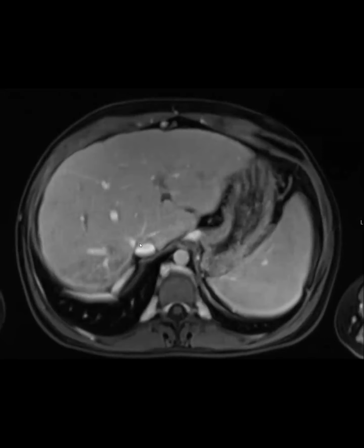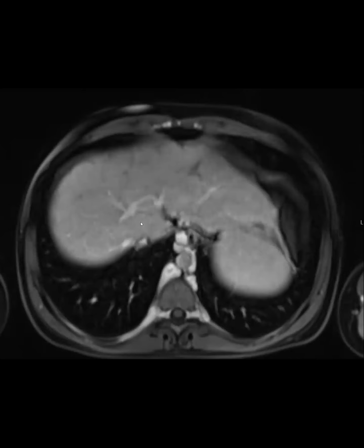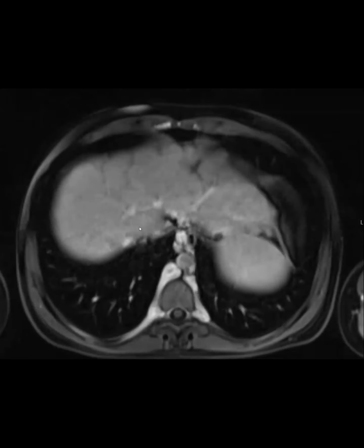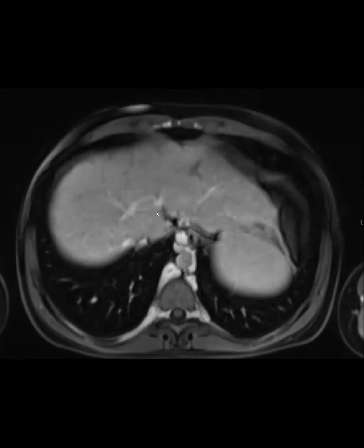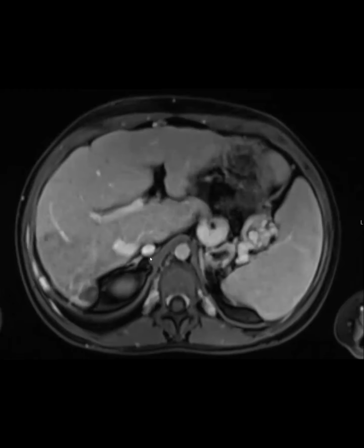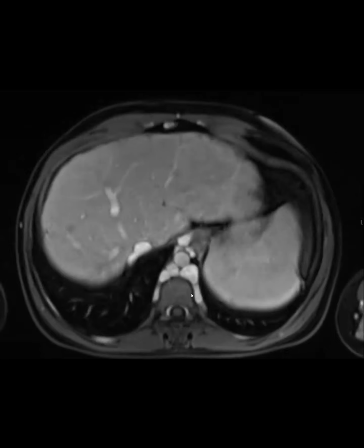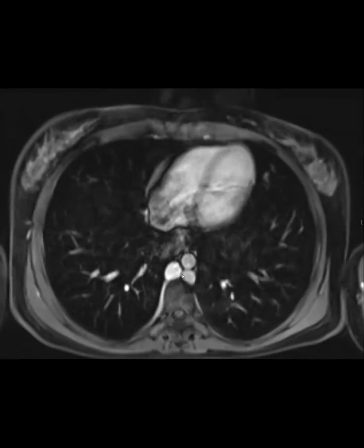Yeah, it's a bizarre course. The normal hepatic veins are almost like what I describe as the spokes of an umbrella, and the IVC is like the center pole. So you don't see that normal bunny appearance. We don't see the spokes. We see it actually draining through intrahepatic collaterals to the IVC. And then we also see these huge intercostal collaterals going into the azygous.